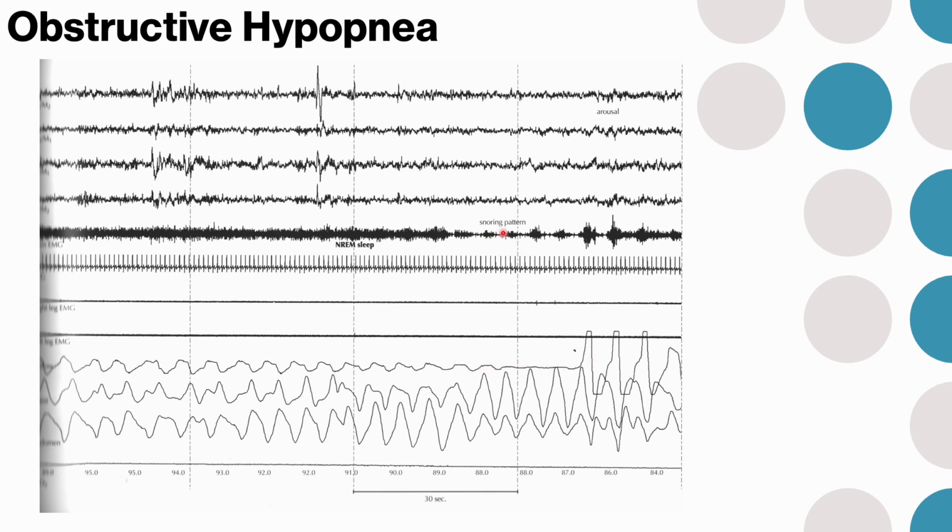Look at this. The snoring is even coming in through the chin EMG. And here's pen blocking. That's when they're taking such big breaths it's going off the page and it can't go any further, so it just stops there. So that's part of the key: is a patient showing just their normal respiration, or are they actually obstructing? Qualify it with notches in the effort. Are they paradoxing? Is the airflow like that? Are they snoring? Things like that are going to confirm that it is a real problem and not just a funny looking signal.